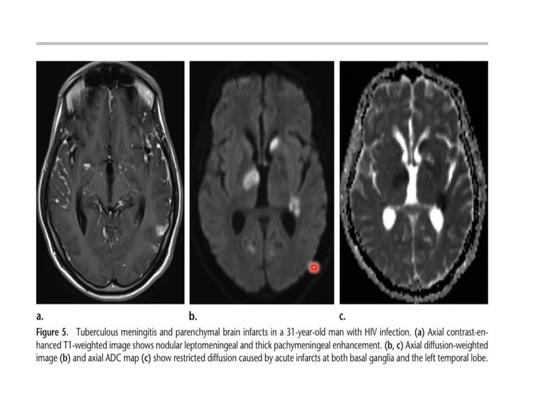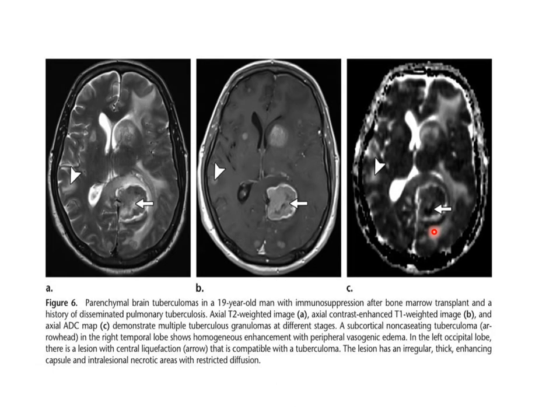This is also leptomeningeal enhancement, and there is also infarction, as we see in the diffusion, hyperintense, and hypointense in ADC. This is all caused by the meningitis.